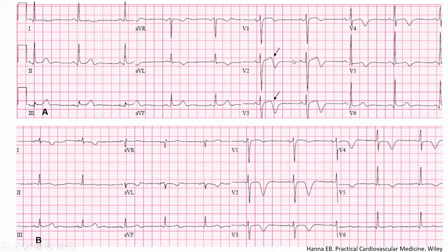I'm going to give you other examples of Wellens T wave. Those are from my book. So those are two other cases. Again, look at the morphology, know it well. It's a straight or convex ST segment, very important. Then you dive deep into a T wave very sharply, almost 90 degree, 60 to 90 degree angle. Again, V2, V3 predominantly, a little bit in V4, V5, but it's not diffuse.